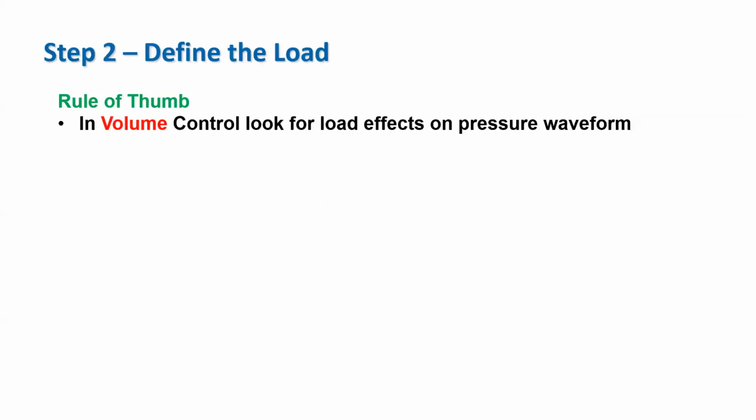Now, the rule of thumb in reading waveforms is this. In volume control, look for load effects on the pressure waveform. In pressure control, look for load effects on the flow and volume waveforms. This is step 2, defining the load.